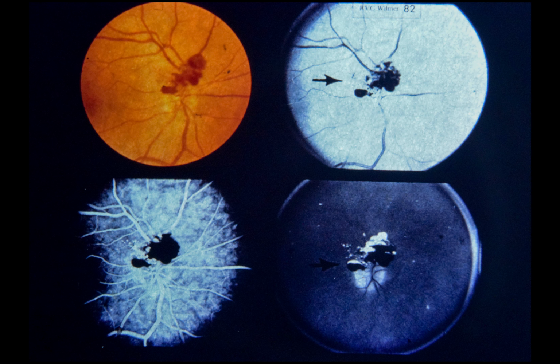Note the plasma erythrocyte separation within aneurysm. Dye fills upper half of aneurysm only, since bottom half is filled with red blood cells. Comment: this lesion was discovered in a 55-year-old white female on routine ophthalmoscopy 10 years ago. A slightly enlarged blind spot was the only positive finding other than on ophthalmoscopy.